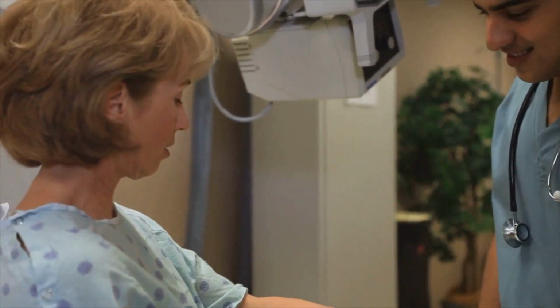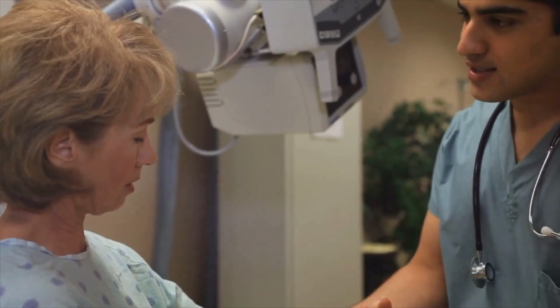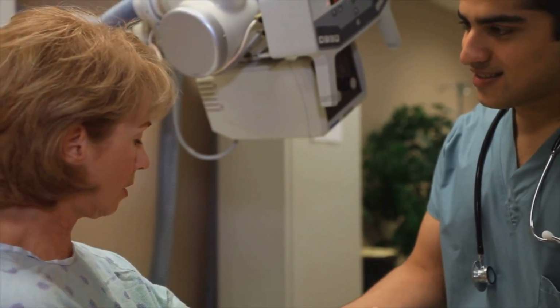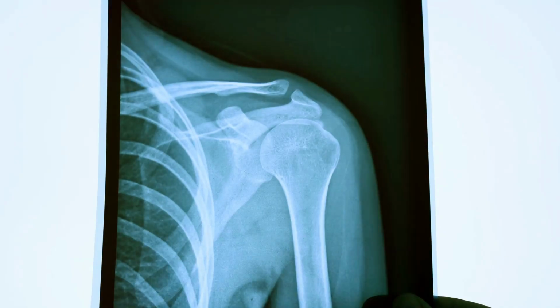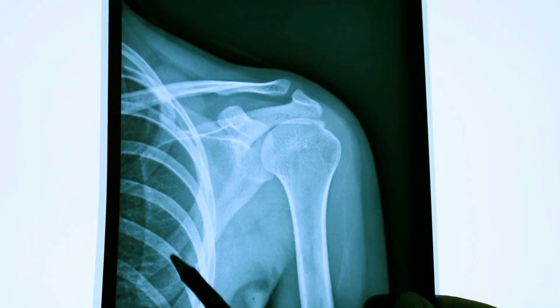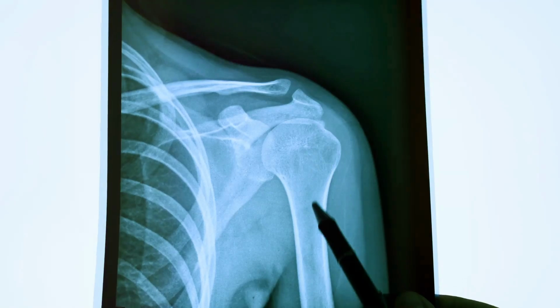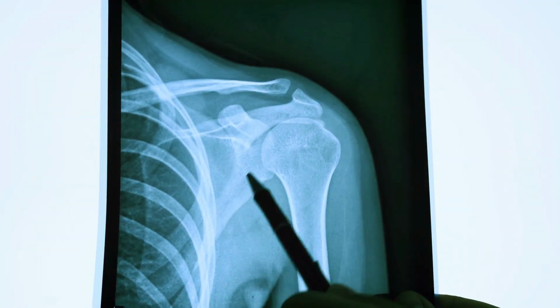Antero-posterior (AP) view. This view is taken with the patient's arm rotated outward, providing a clear image of the shoulder's front. It shows the humeral head, glenoid fossa, and proximal humerus, which are crucial for diagnosing fractures and other abnormalities.